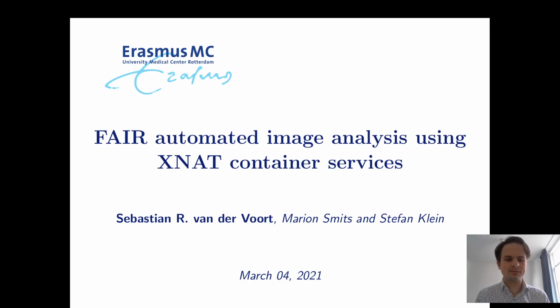Good day everyone. In this workshop I will give you a short overview of some methods that we developed for the automated image analysis of MRI scans using XNAT container services. I will first start with a brief introduction of what XNAT looks like for those of you who are not familiar with this system.